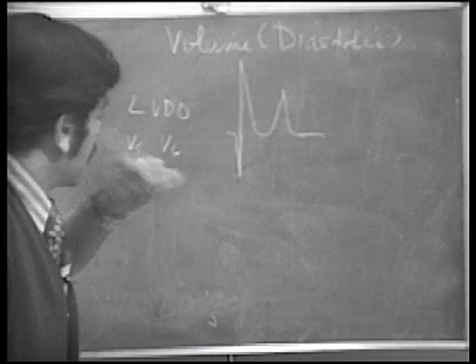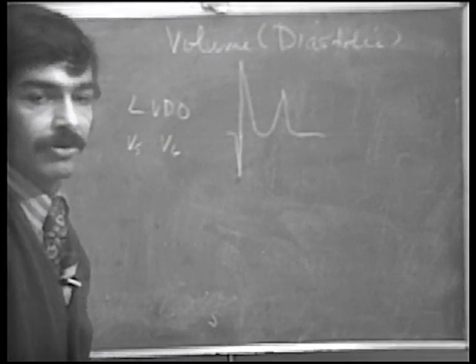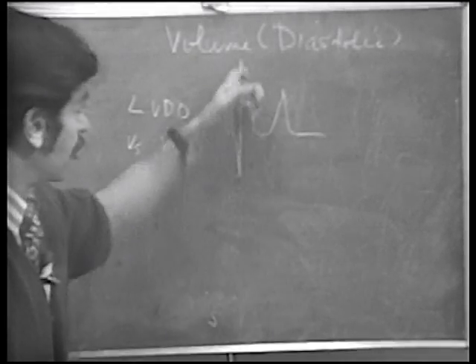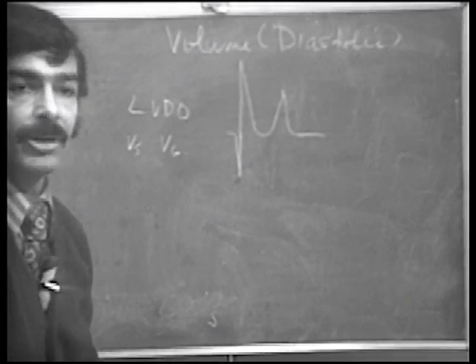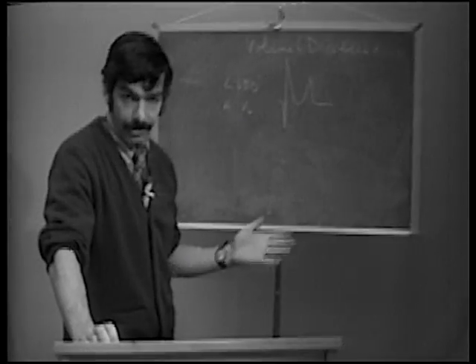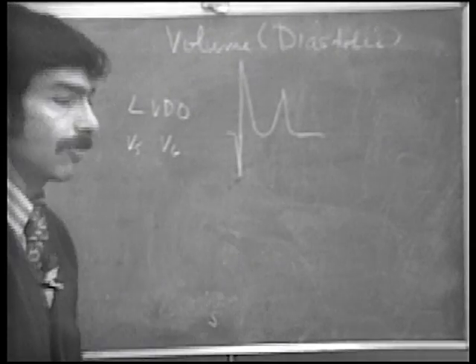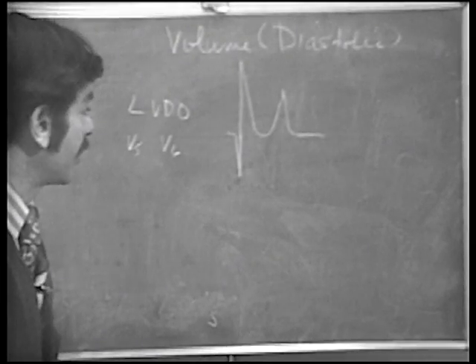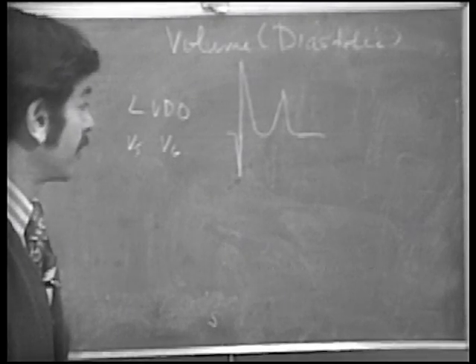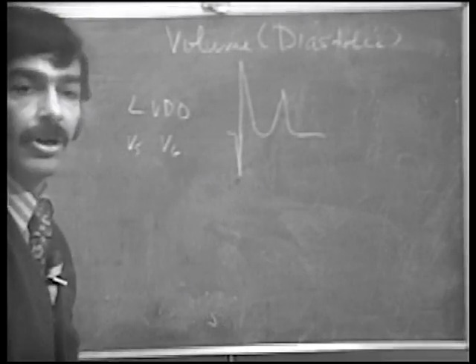Okay, suppose you were to approach an electrocardiogram that looks like this, though. Certainly there are other things that will give you large Qs in the lateral leads, such as what? Some things that you have to consider. Right, one would be lateral wall myocardial infarction. This might be an old lateral wall myocardial infarction. However, if you had a 15-year-old boy as a patient, that'd be fairly unlikely. What's another thing that might give you a large septal Q?